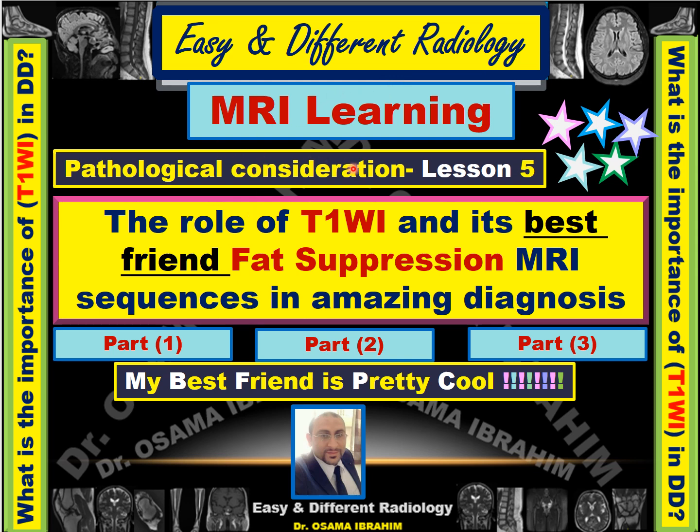Actually, after the previous 4 videos in which I talked about MRI introduction, I think all my friends who listen to these videos are now more familiar with MRI examination. So from now on, every Wednesday, I decide to start an MRI learning series depending on pathological consideration. Today, my topic is the role of T1 weighted image and its best friend, fat suppression MRI sequences, in diagnosis.